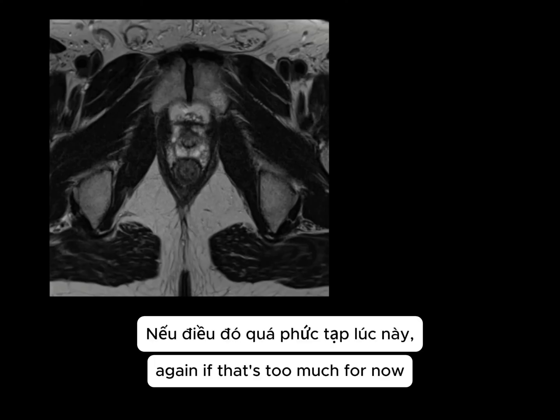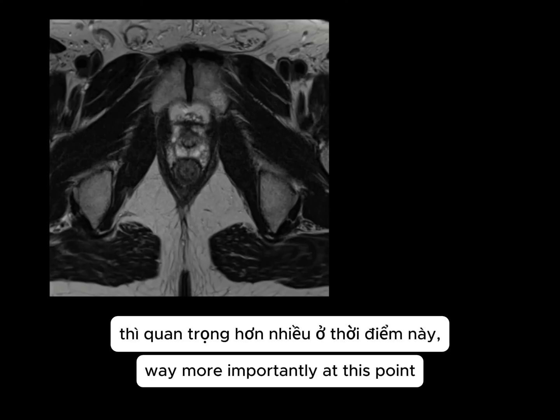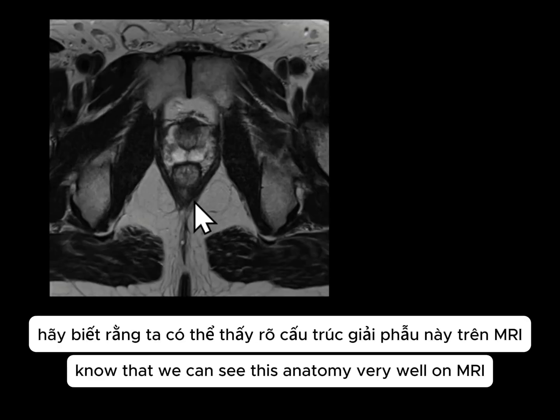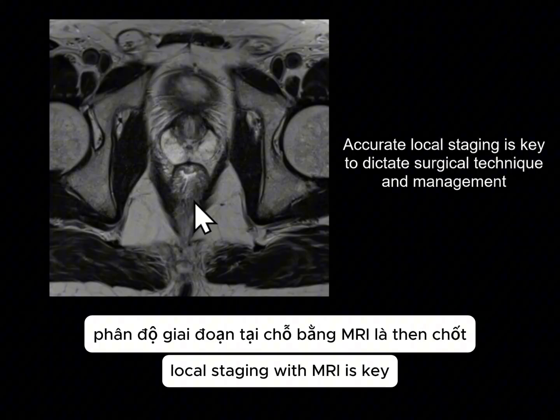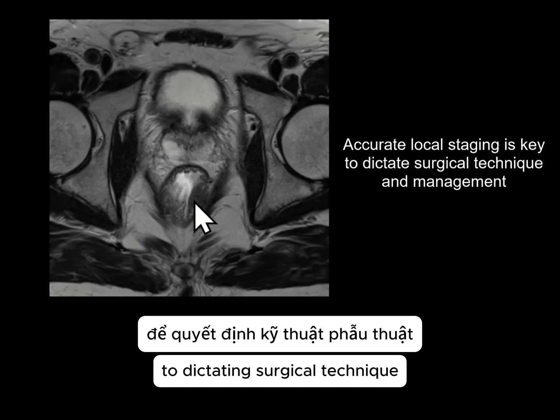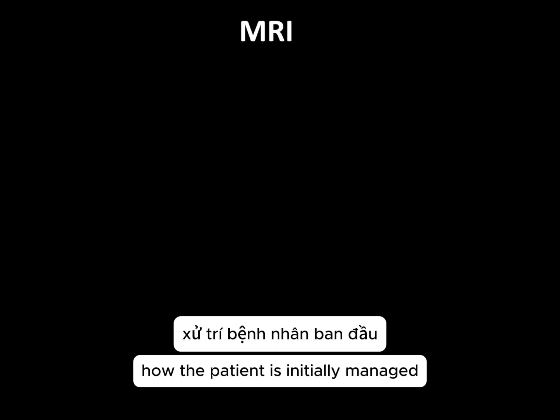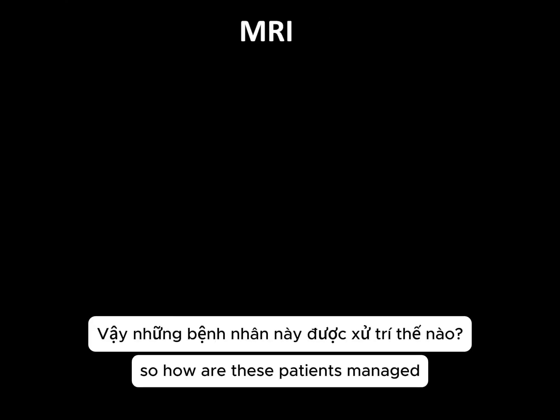Again, if that's too much for now, way more importantly at this point, know that we can see this anatomy very well on MRI, so accurate local staging with MRI is key to dictating surgical technique and key to dictating how the patient is initially managed. So how are these patients managed?